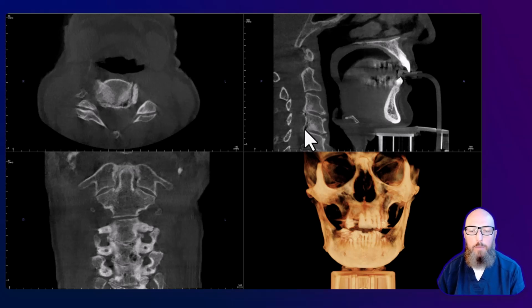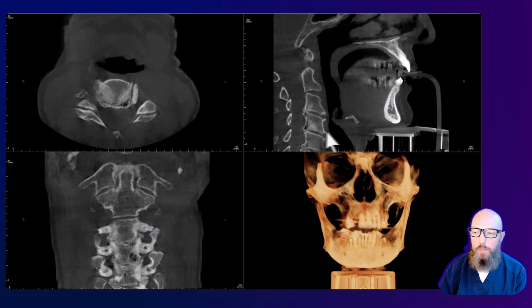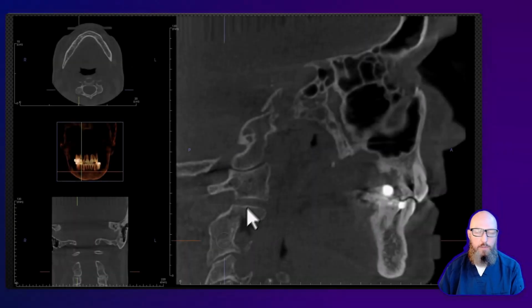And that's kind of a unique thing about the spine. They call these pneumocysts. This is related to intervertebral disc vacuum phenomenon, is what they call it. It's an accumulation of nitrogen gas, but it is just associated with osteoarthritis. Just another example of the spine.